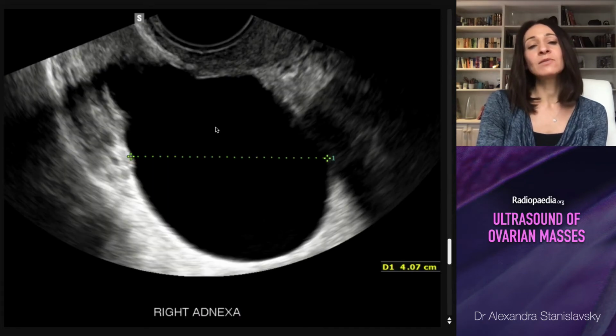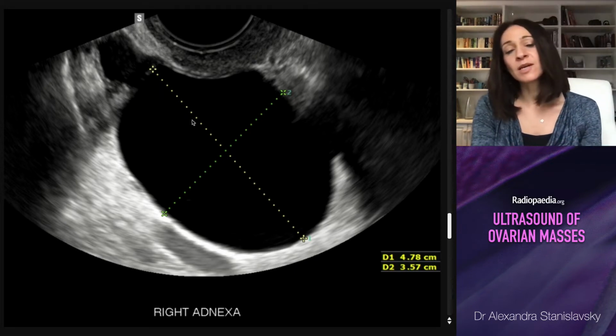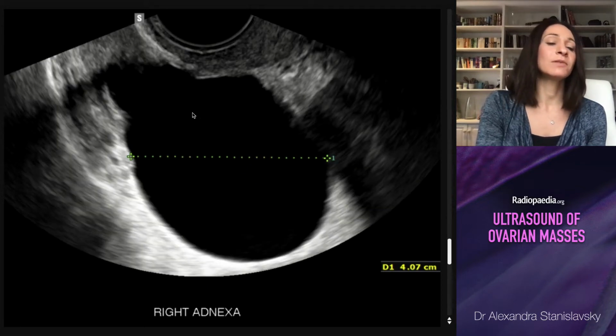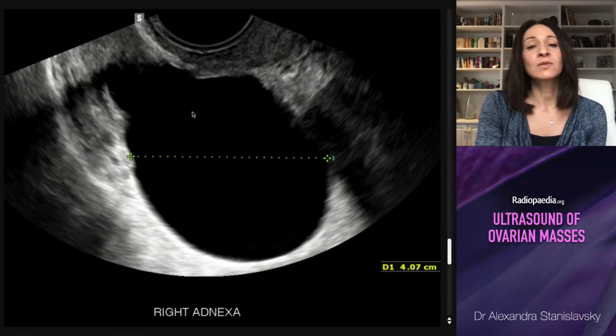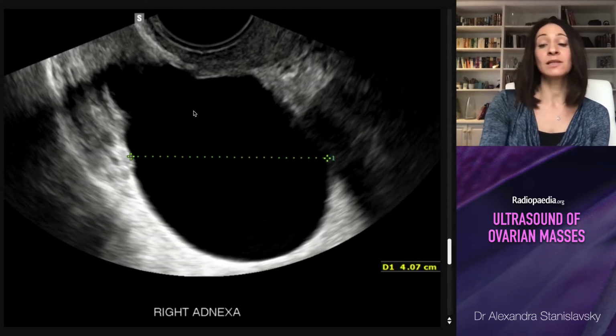In an 80-year-old female, obviously it's not normal to have a 5 centimeter cystic lesion in her adnexa. However, there is nothing that's outwardly concerning about this. There are no solid components, there's no vascularity. The appearance overall is quite reassuring, so I would say that this is likely to be a benign lesion, such as a cystadenoma.